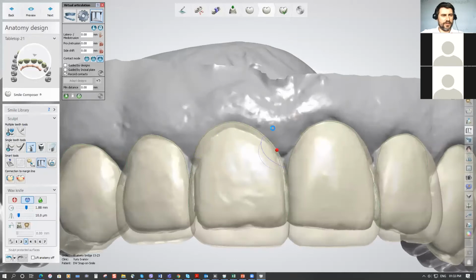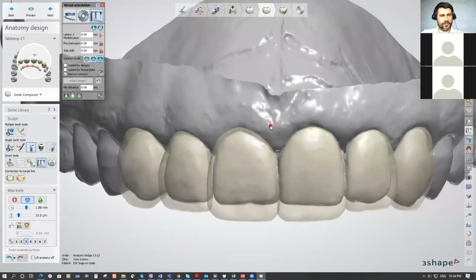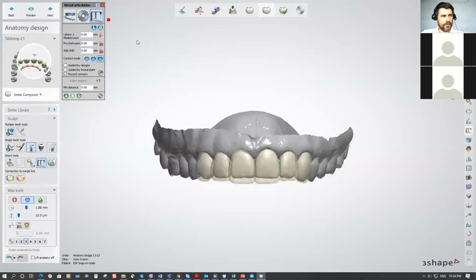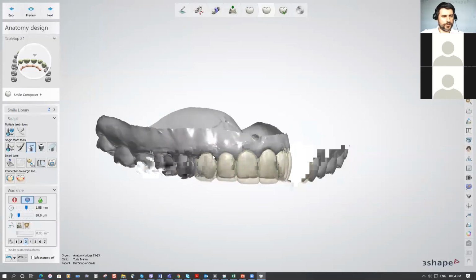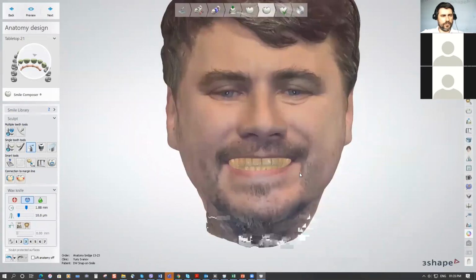It means this snap and smile construction could be placed over the teeth in the patient's mouth, and it's going to be a kind of guide to cut out the soft tissue in this area to have equal length of the teeth with a nice smile. This is the way we could play with the soft tissue changes, for example, in areas like near the canine, it looks like.